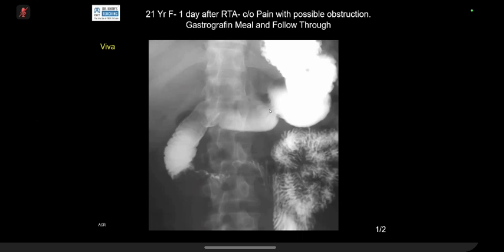It's a unique pathophysiology. If you see here, this patient presented with this, and follow through. On follow through, you can see that contrast goes till D2, but here there is no obstruction. Very unique. There is no obstruction because contrast has gone into the jejunum. But the lumen is this. You see, this is the lumen. So from here to here is a filling defect.